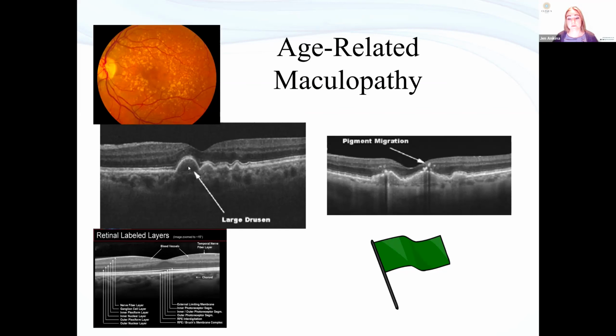Differentiating between exudates and pigment migration. Yeah. Pigment migration you will usually see as dark spots. So on this picture, those little RPE changes, those little dark spots near the fovea, will usually be pigment migration, whereas exudates are usually white, but they do look similar on OCT pictures. They do. So you again correlate with the clinical picture, with the color photo. That's fine.